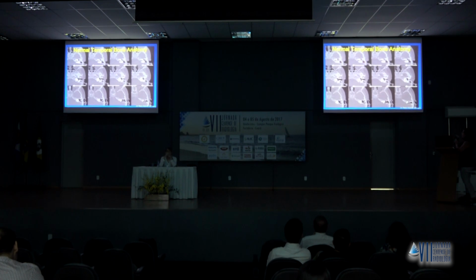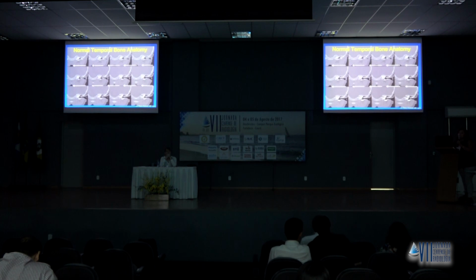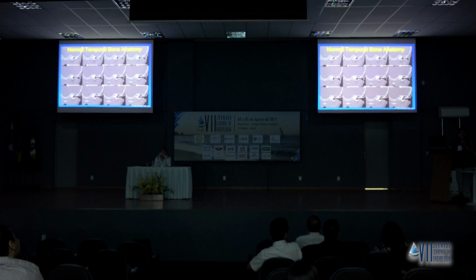And in this region, you also see the inner ear structures, the internal auditory canal, the vestibule, the semicircular canals, and the mastoid air cells. Mastoid air cells are also quite important to evaluate. When we do temporal bone imaging, we typically acquire our images with 0.5 millimeter thickness in the axial plane and reconstruct the coronal images off of it. And here you do see the coronal reconstructed images of the normal temporal bone.